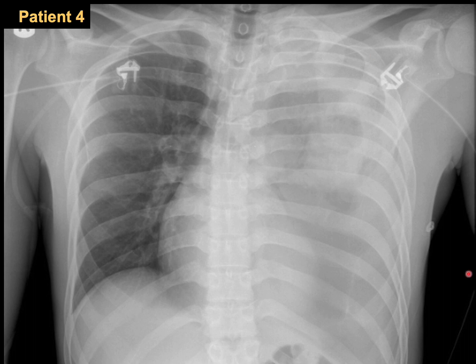Let's go for patient number 4. 20 years old male in distress after a fight. He has been stabbed on his left side of his back. Okay? So again, go for A, B, C, D, E. A, I think all of us can appreciate that the trachea is pushed to this side when you compare it to the position of the spine. Okay, it's very clear. Okay, then B, the lungs.